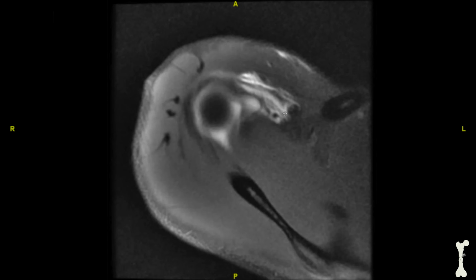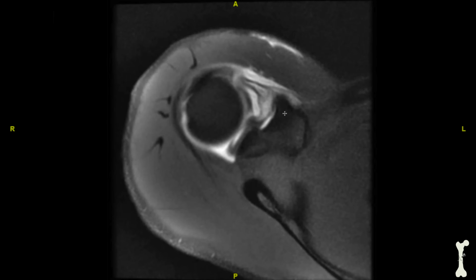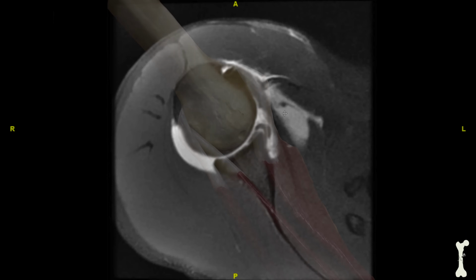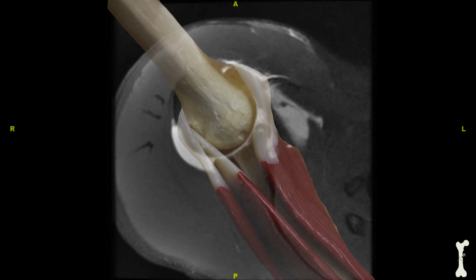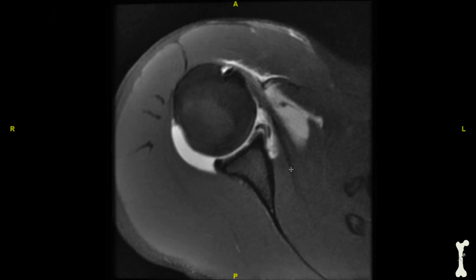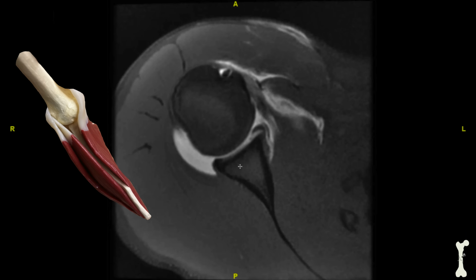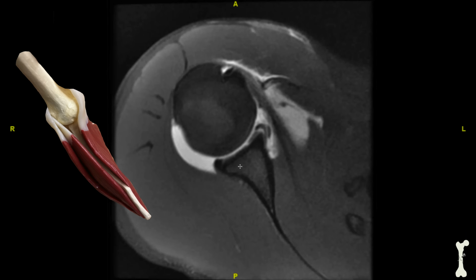So we'll come deeper into the shoulder. Each image is getting deeper and deeper into the shoulder. And now we come to right here, where we can see the ball and the socket. So you really get an idea of how the shoulder joint behaves almost like a golf ball on a golf tee. And so humeral head, glenoid, and then this orientation lets us look at a couple muscles in a little bit better perspective.